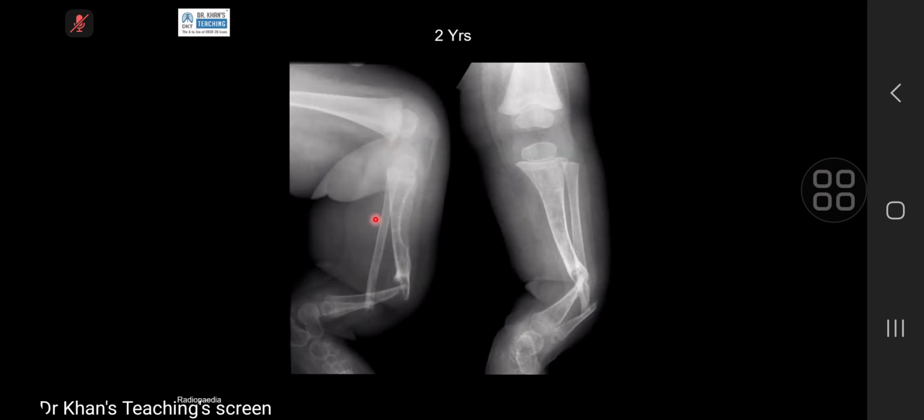Now, this is from Radiopaedia, another example, which also tells you basically what happens in pseudoarthrosis. The bone is usually the tibia, please remember, usually tibia, and fibula number two. Then it can also be radius and ulna. Look at the word dysplasia.